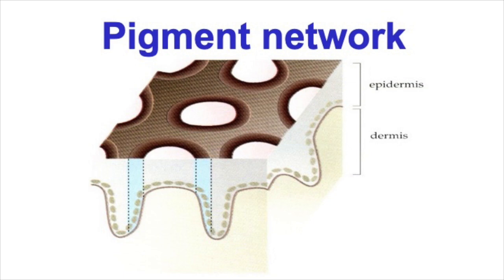And think about this a little further. If it's a superficial spreading melanoma and it's starting to disrupt this rete ridge pattern, it's going to lead to some kind of chaos to the network, an irregular network. Right? So the difference between a nevus and a melanoma when it comes to superficial spreading melanoma, when we look at network, is whether the network is regular or irregular, okay?